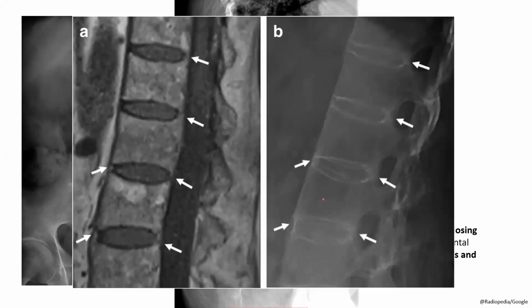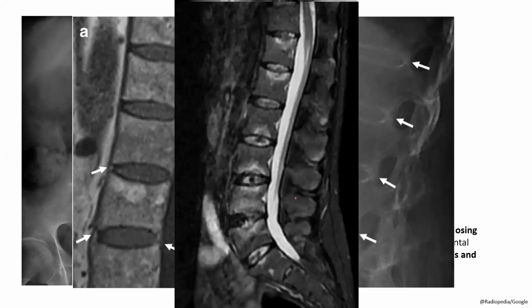You can also see thin syndesmophytes, which are thin linear ossifications that bridge along the intervertebral disc. So these are thin syndesmophytes, which indicate seronegative spondyloarthropathy. You can also see Andersson lesions in ankylosing spondylitis, which is basically a spondylodiscitis type of appearance, which affects the end plate as well as the intervertebral disc.